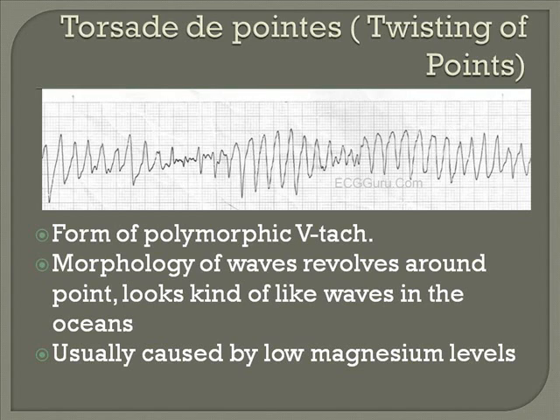The reason it's important to notice this is that when it's occurring, it's almost always caused by a low magnesium level. You can shock this person out of this, but if you haven't corrected the magnesium level, they will just return right to it. So it's something that you will find in the advanced cardiac life support algorithm that when you have this, the first treatment is administering IV magnesium.